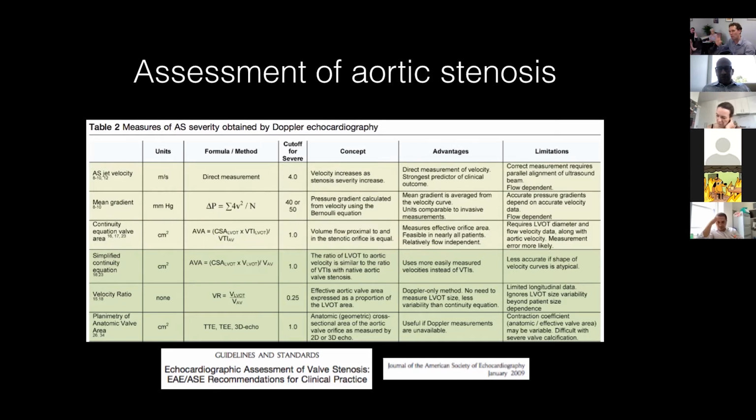What about that Doppler profile? You need to measure the modal velocity, so you need to avoid the beard, the fuzzy part of the curve. So how do you get rid of the beard? How do you get rid of the fuzz?